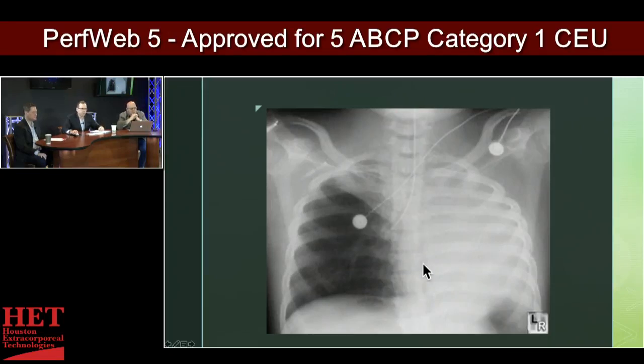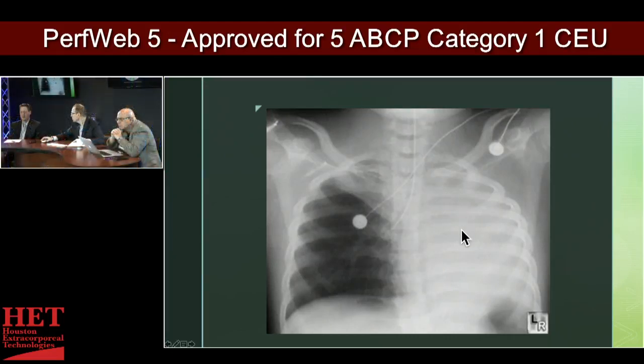So the corrective steps would be, number one, do a needle decompression or an emergency chest tube to this side to relieve the tension, and then withdraw your ET tube to better ventilate and oxygenate both sides. And so this can be completely collapsed, or this becomes opacified from mucus plugging, et cetera, which causes the consolidation in the left side.